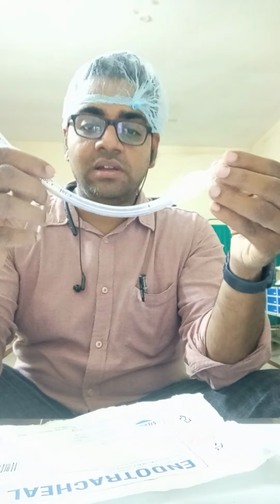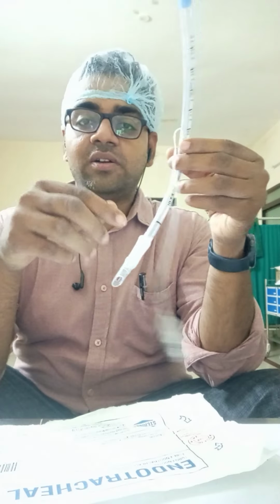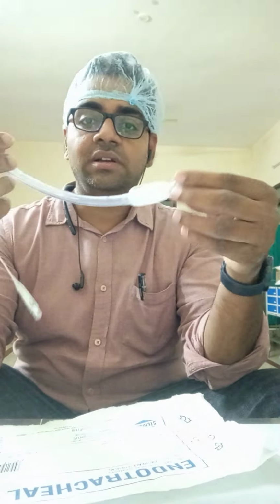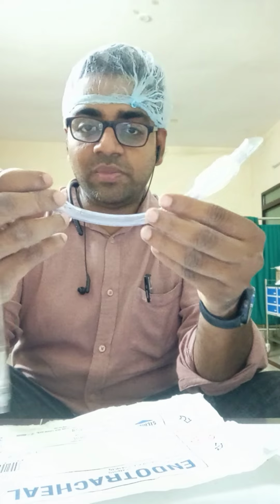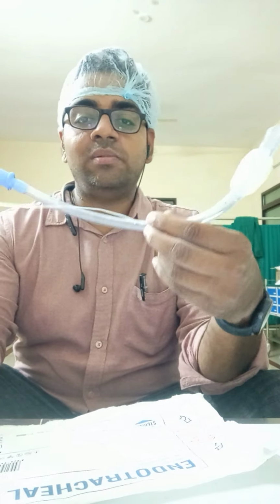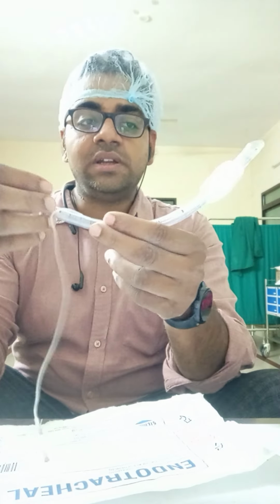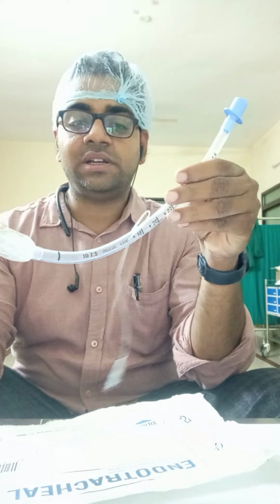Clinically, in patient settings, we have to adjust it according to the height and neck of the patient. It's a decision of the healthcare provider who is using this ET tube. The points to remember: this is a curved ET tube, this has the cuff, this is the pilot balloon to inflate air or saline depending on what you are using. Then this is a curved tip to avoid injury, there is an eye, this is the ET tube connector, this is the patient tube.